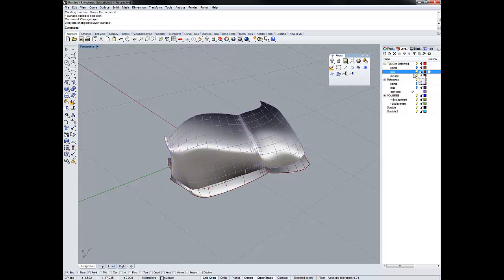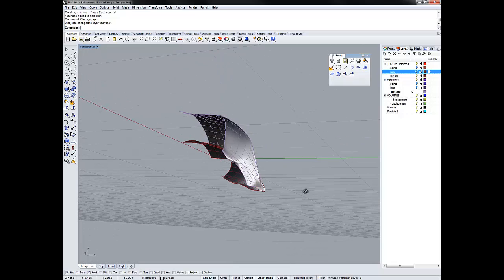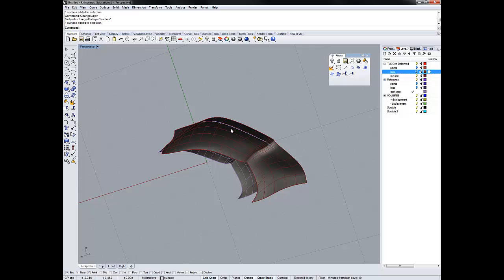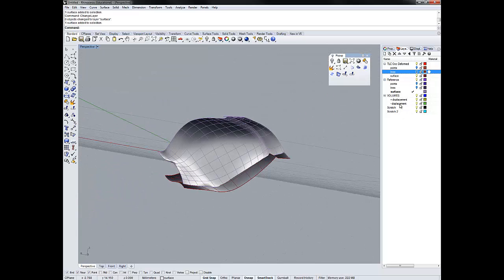At this point we have 2 surfaces. We clearly have our reference surface. It's purple, you can tell that, and you can check the layer. And we also have our occluded, deformed TLC surface, and that's red here. The next step is to overlap these surfaces and create volumes. That's where our positive and negative volumes come in.